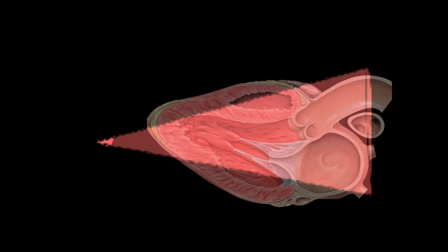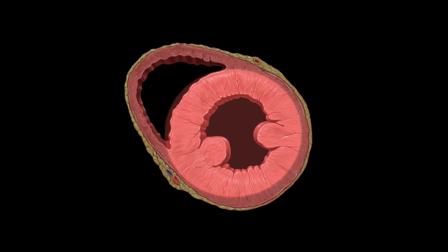So once again, thinking about that left ventricle as a cone, initially you had it on the long axis. Now if you turn it 90 degrees, you're going to see what looks like a circle because it's just like a cone, right? And that's exactly what you should see. You should see a really nice circle for that parasternal short axis view, and there's a few different views you can get on the parasternal short axis view.